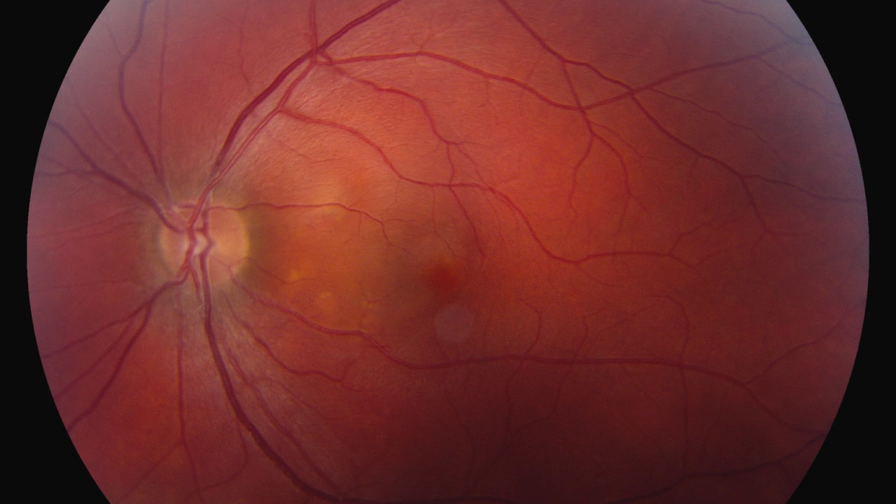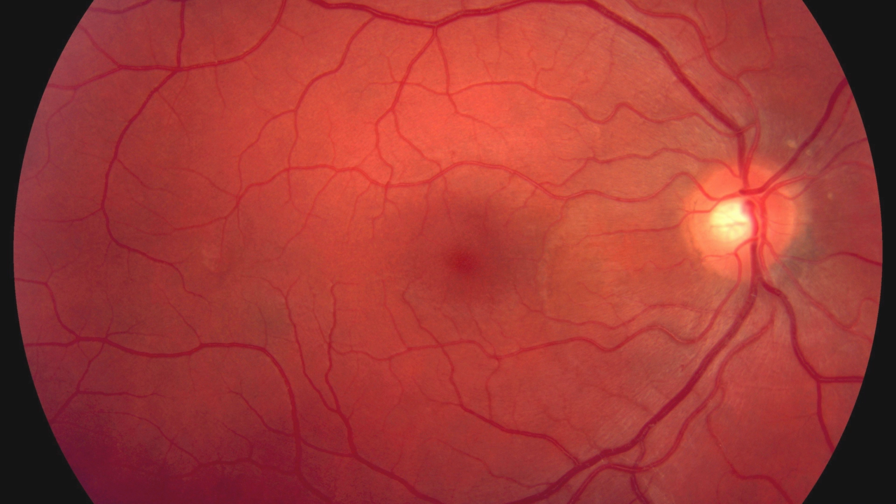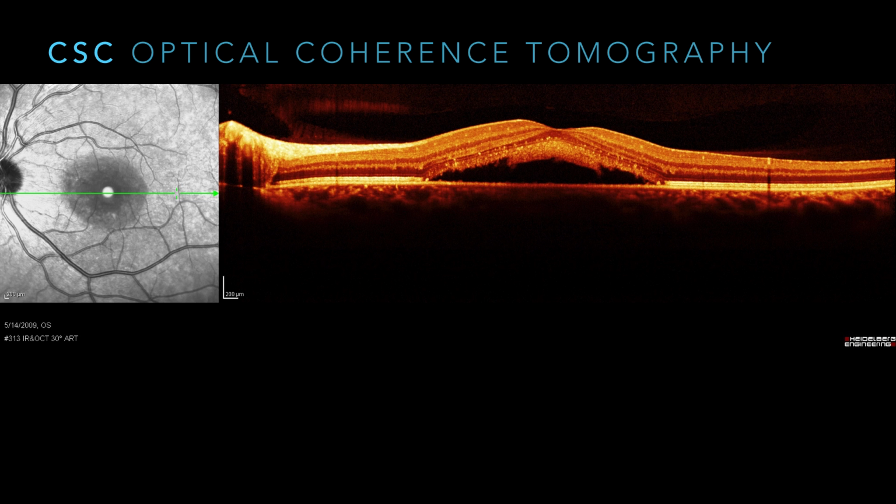So this image shows again another subretinal fluid blister closer to the nerve this time. So you want to look at the nerve closely, make sure there's not an optic nerve pit, and another one of the same thing, just a right eye.